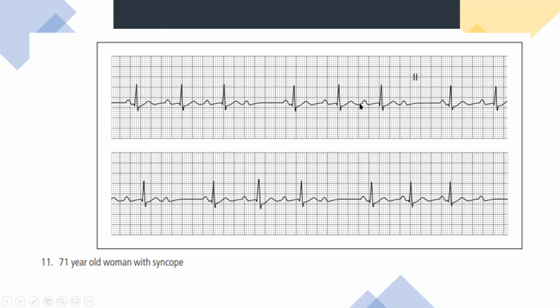We've got short, longer, longer, drop. Short, longer, longer, drop. Short, longer, longer, and drop.